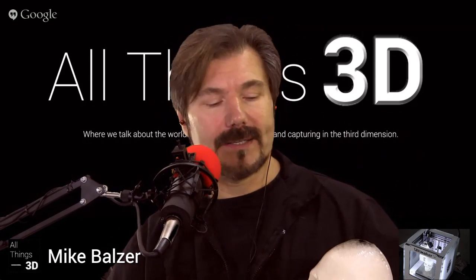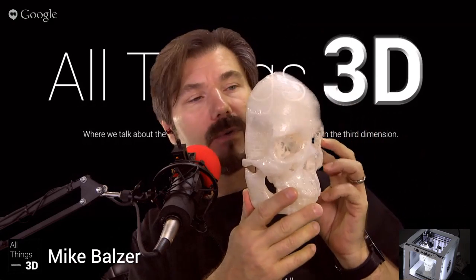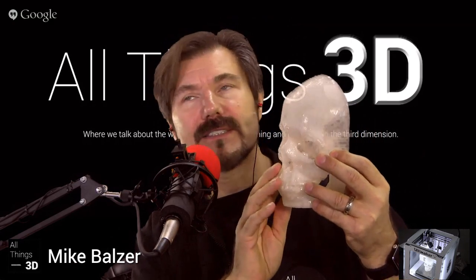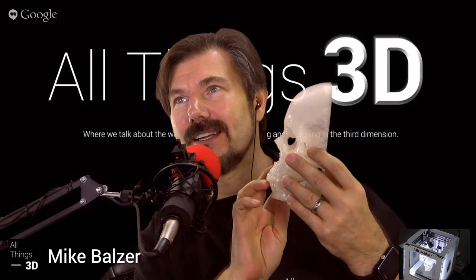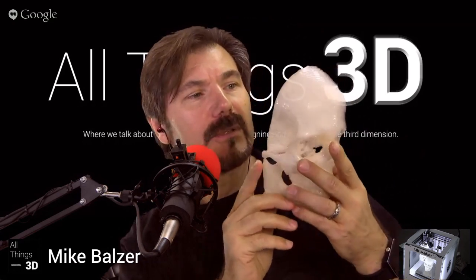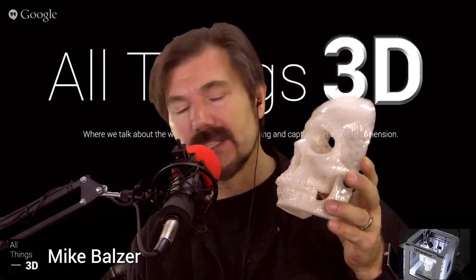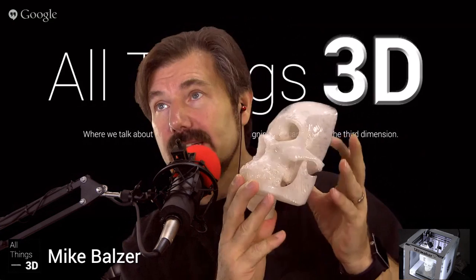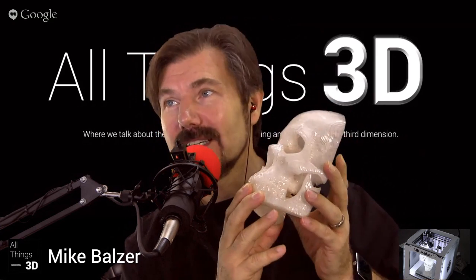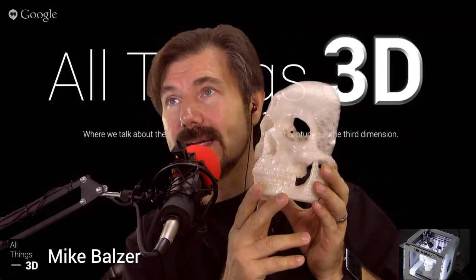Now, we talked about 3mm, which was this one. And now we can look at 1mm. Now this was the CT scan done at UPMC with 1mm resolution. Notice the smoothness. Now it is somewhat translucent, so it's not like you're seeing a ghost there. I did use a translucent material with this one. And this was an after. If you notice, the other one had a tumor. Now she has, as I call it, another hole in her head. As you can tell, we kind of kid around a lot. In fact, this is the one that you may have seen in Make magazine.